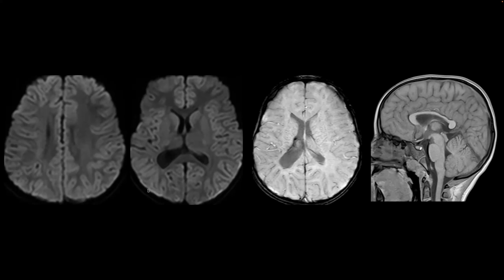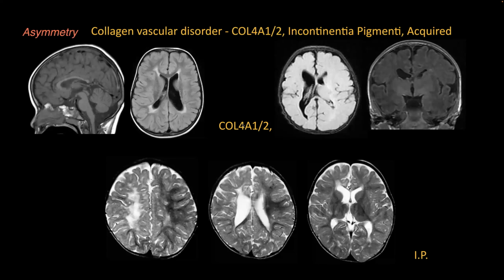I also checked the subcutaneous fat on the scalp. There was no deficiency, and no other lesions. I think it was commented as a PVL mimic. The involvement here is slightly more only on the right side, not on the other side, so I'm not sure if we can term it as PVL, but these are some differentials for the slightly asymmetrical involvement.